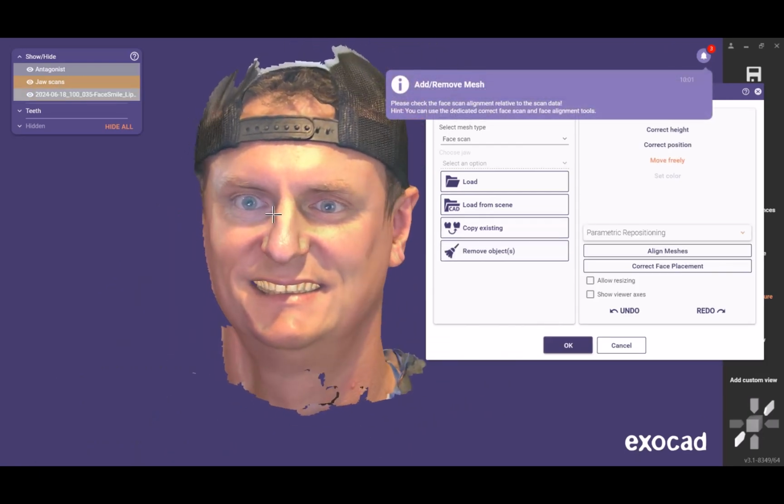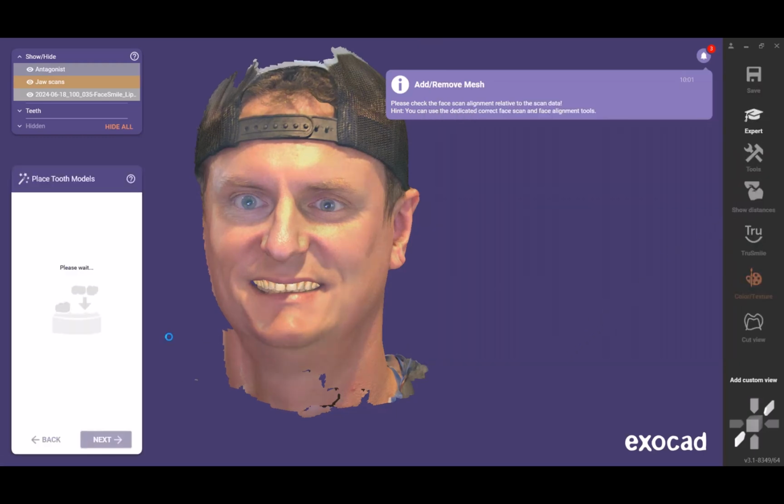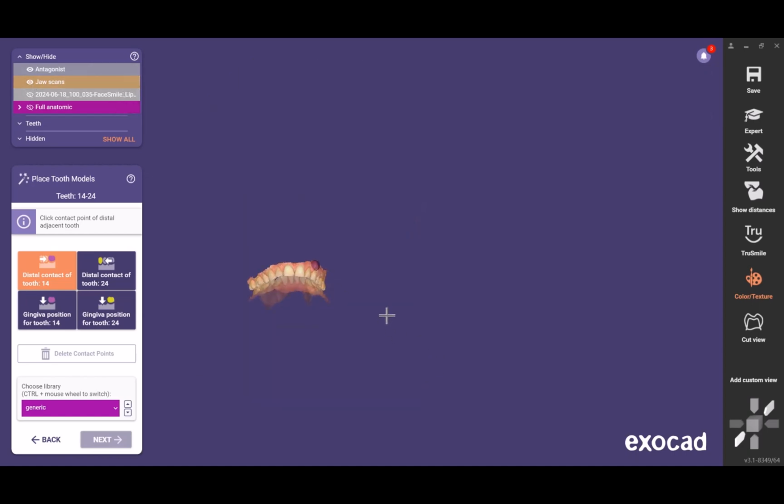You see how everything is lined up? So now I could click OK, go back into my wizard, and begin the process of doing the wax up.